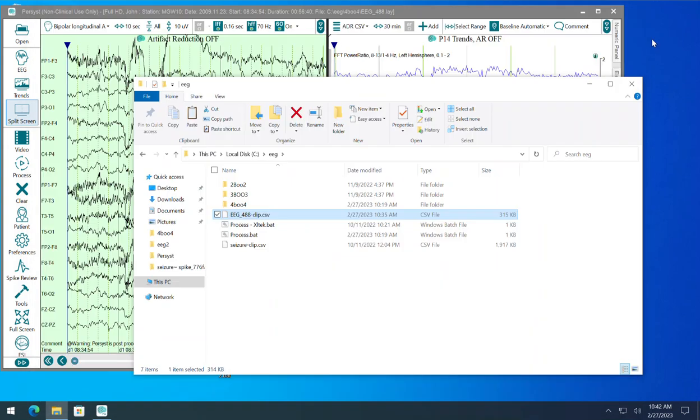And if we go back to the original window, well, any other questions, let me know. But in a nutshell, the main thing with that CSV output is the format of it. Each iteration will have to do with the type of trend that you're exporting and the population of that trend display. And that varies by the trend type, as you would expect.